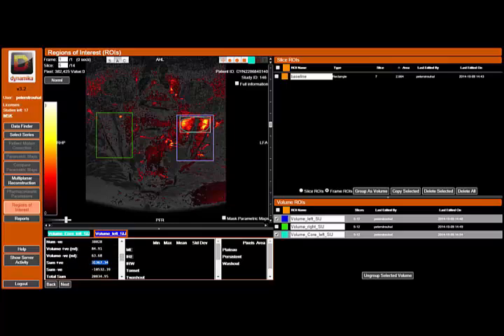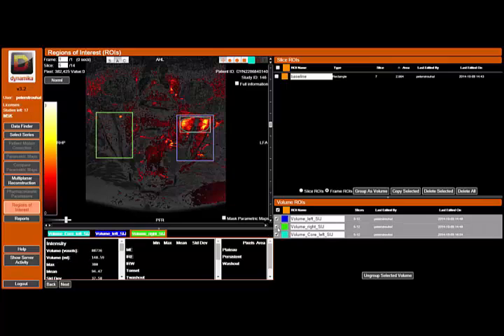What we don't yet fully understand is the significance of the pixel values within the smaller regions of interest, localized to the foci of highest marrow signal intensity around the left SI joint. We don't know whether that's going to specifically correlate to disease, what information it's going to tell us about the disease process, how active it is or not, but there is a suspicion that we should be able to gauge disease response on follow-up images using these peak regions of interest.